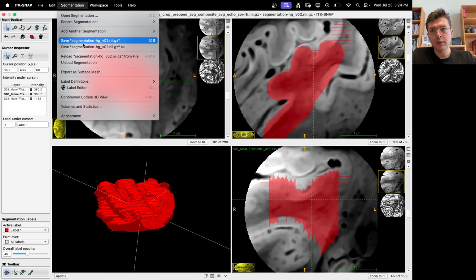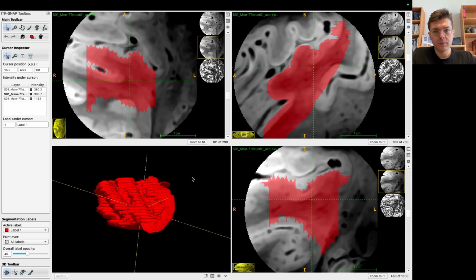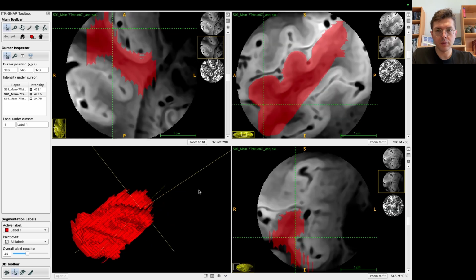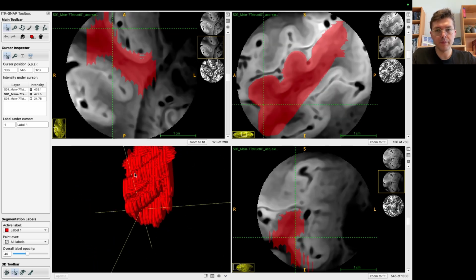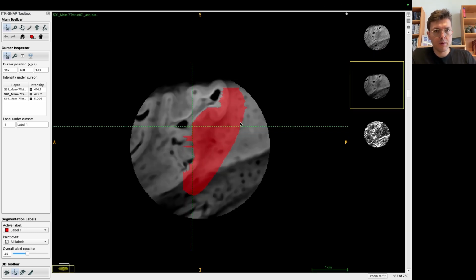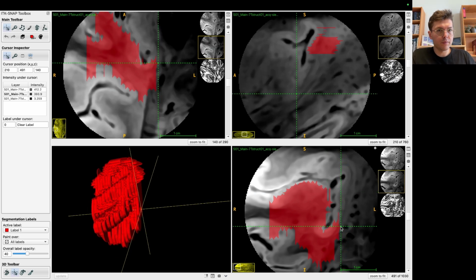Okay, the same idea. Let's load. Things are filling up a bit more. You can press on this button, 3D crosshair mode, and this allows you to jump on the geometry in 3D. This is also pretty handy. Okay. Now let's do a bit more finer work. Let's say here. Now I'm going to do every 3.